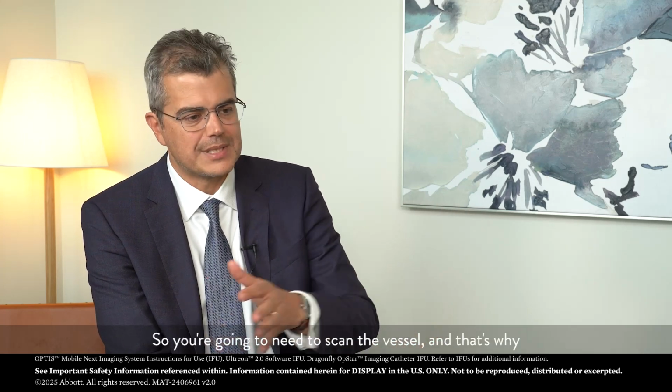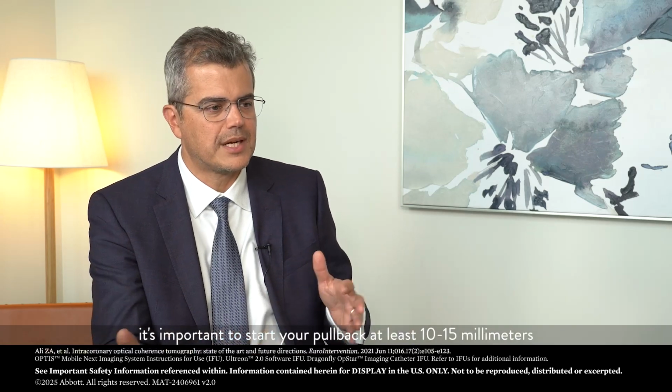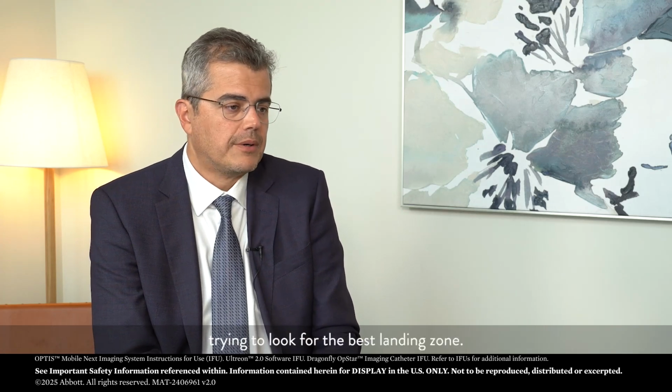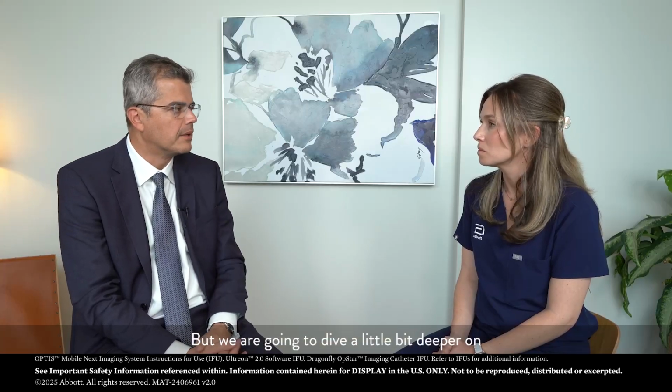So you're going to need to scan the vessel, and that's why it's important to start your pullback at least 10-15 millimeters distal to your lesion, trying to look for the best landing zone. But we're gonna dive a little bit deeper on procedural planning in another chapter.